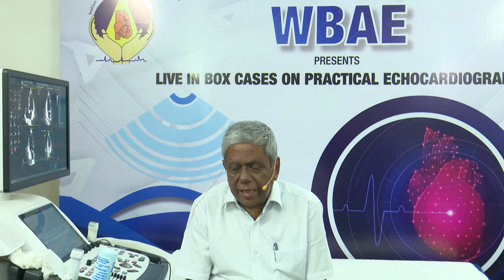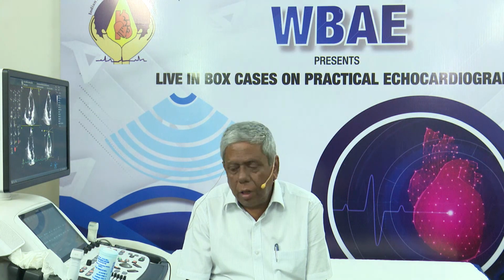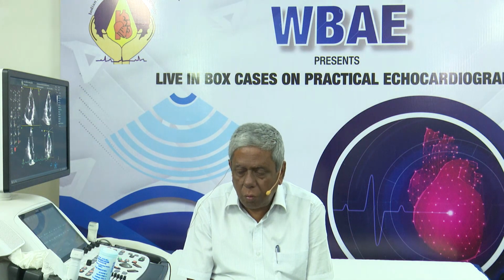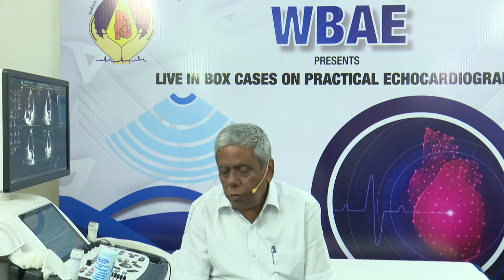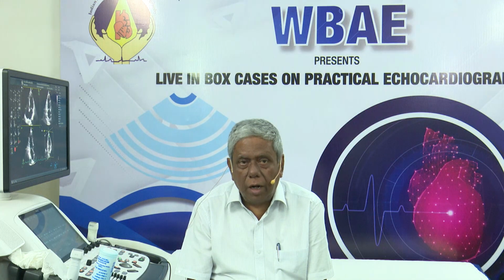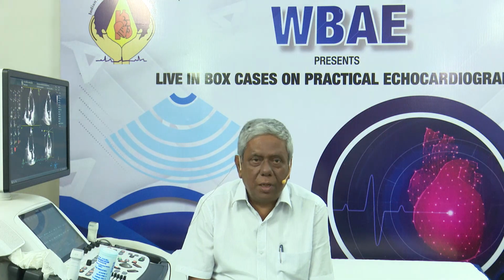Now I will go to the second case, which is another spectrum of right heart pathology. This was a young girl, 24-year-old, acutely dyspneic, had a fever, had come to a friend of mine for evaluation, who subsequently referred her to me for doing the echocardiography. Unfortunately, in this case, the video files are not running, so I have to do with the still images only, which is a gross compromise, but I hope you will accept it.